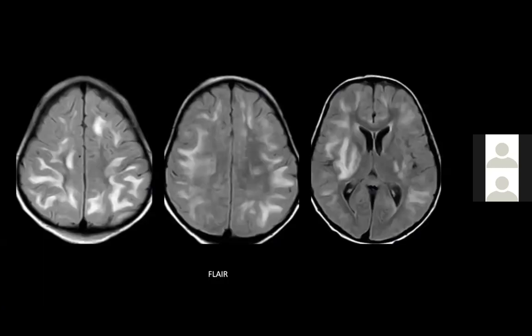So this is a FLAIR image in axial plane showing multiple patchy white matter disease in both cerebral hemispheres involving the deep gray matter, involving the subcortical white matter, involving the U fibers. And these are patchy, asymmetric disease involving predominantly the white matter. So we give a differential of ADEM in this particular case, given the history and the presentation of the patient and these imaging findings.